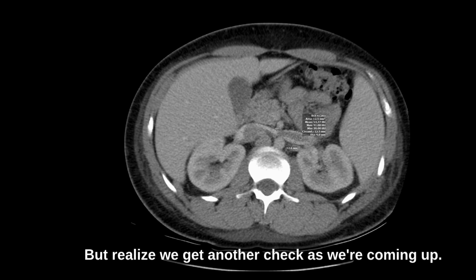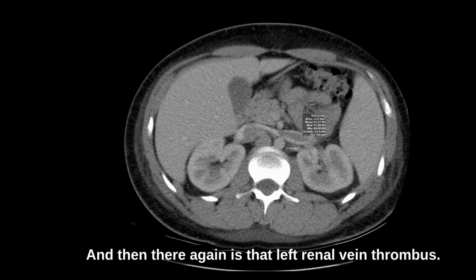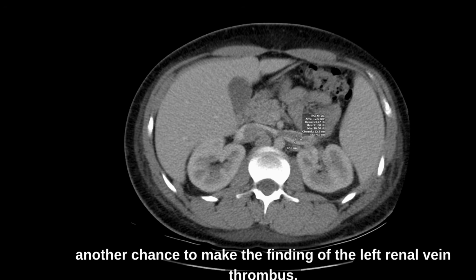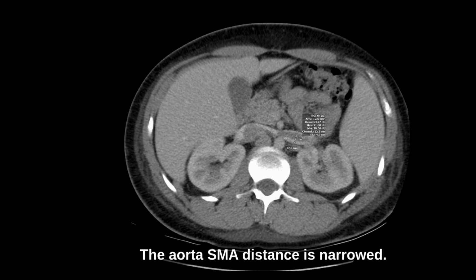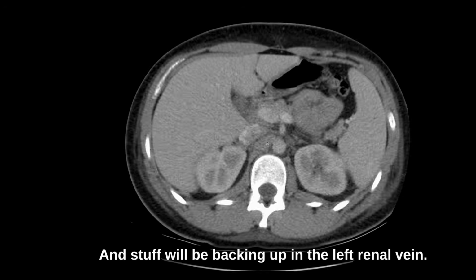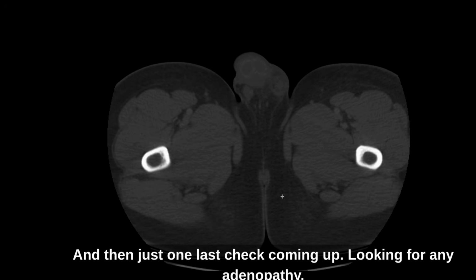But realize we get another check as we're coming up. I'm going to double check the aorta, IVC, SMA ratio, and then there again is that left renal vein thrombus. So in my retroperitoneum checklist, I got another chance to make the finding of the left renal vein thrombus. And sometimes you'll have the nutcracker phenomenon. The aorta SMA distance is narrowed, and the blood will be backing up in the left renal vein. So that's a good thing to be looking for. And then just one last check coming up, looking for any adenopathy.